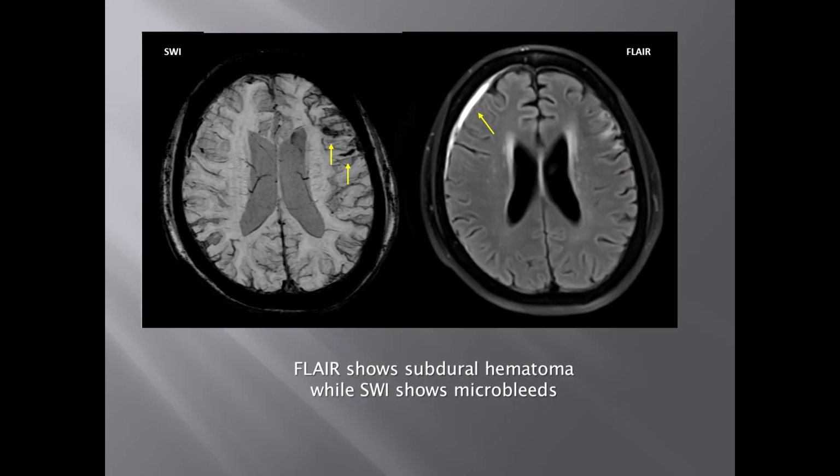And in another more subtle case than this, you can see here, again in the frontal left side of the brain, not only evidence of microbleeds, but also darkening of tissue, which is representing reduced levels of flow to the capillaries. And just like in the stroke cases we looked at, this likely represents a whole region of perfusion deficit here that you can first make some hint at using SWI, even if you didn't do perfusion.